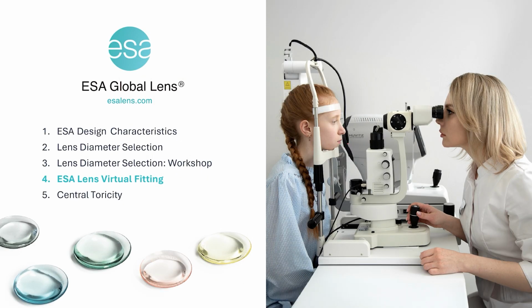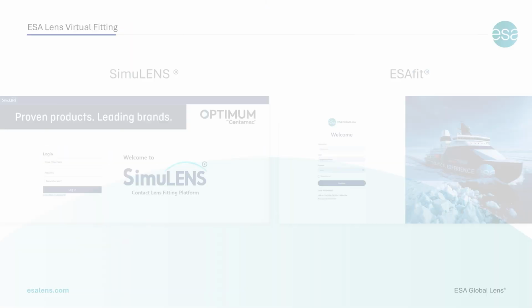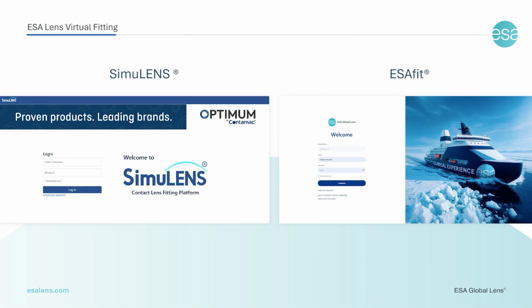Let's proceed to the fourth part of the course, Virtual Lens Selection with ESA. Virtual fitting significantly simplifies the practitioner's workflow, making it considerably more efficient. This can be undertaken using either of these two platforms, ESAFit and SimuLens.